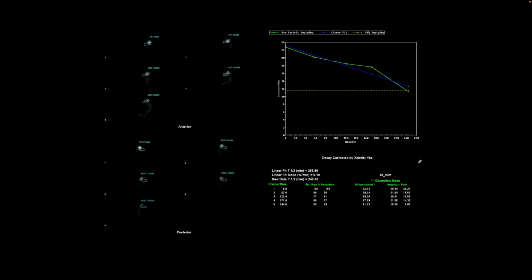This is our next patient. We performed a gastric emptying study. And so after they ate the standardized egg sandwich cooked using technetium-99m sulfur colloid 1 millicurie, we acquired anterior and posterior images of the abdomen, and we have drawn the region of interest and derived a time activity curve.